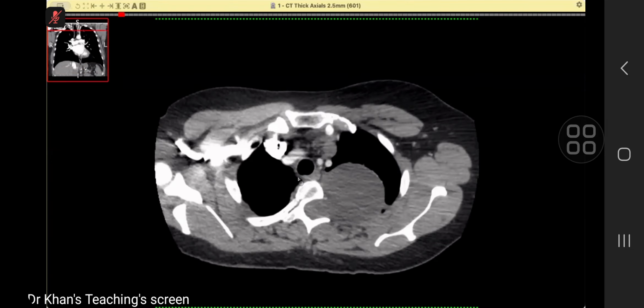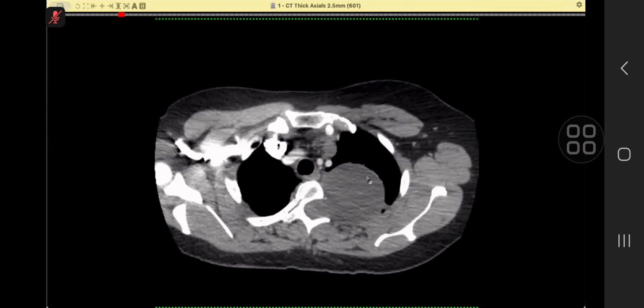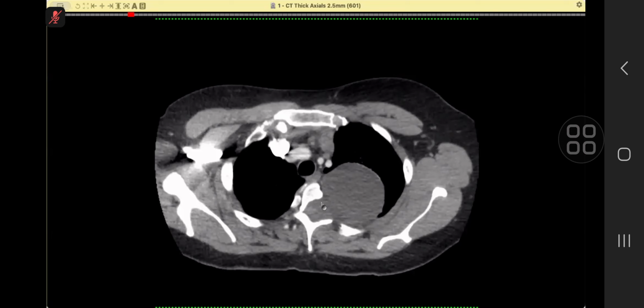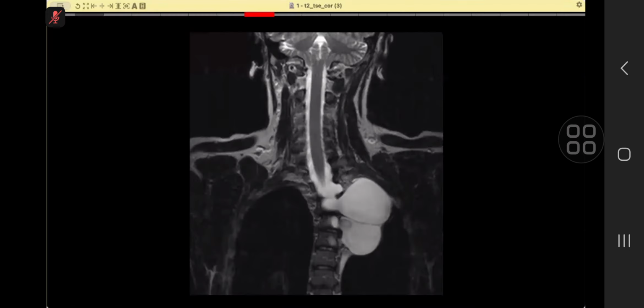And my first differential diagnosis is in keeping with a neurofibroma, as it tends to widen the neural foraminal space. In my routine practice, I will also ask for an enhanced dorsal MRI with contrast. I will convey my finding to the referring physician.